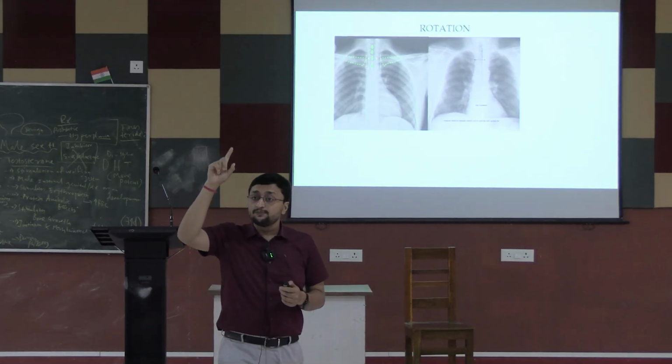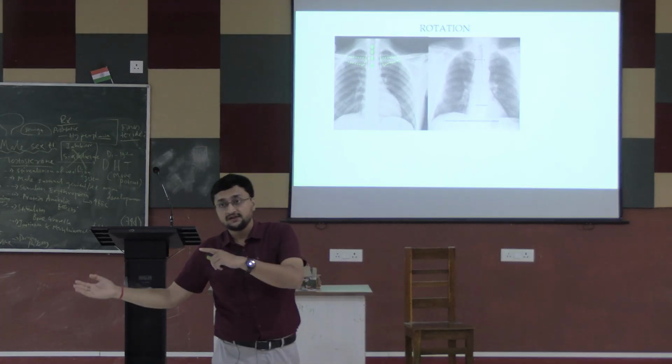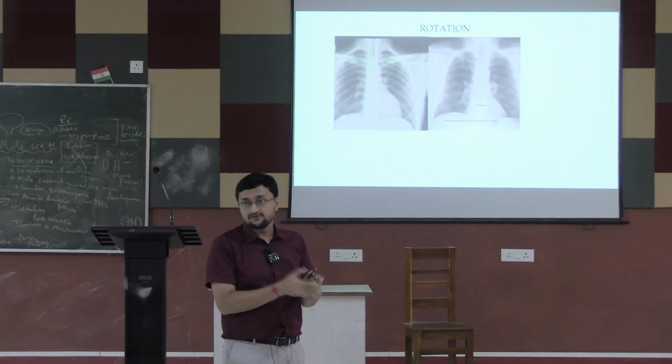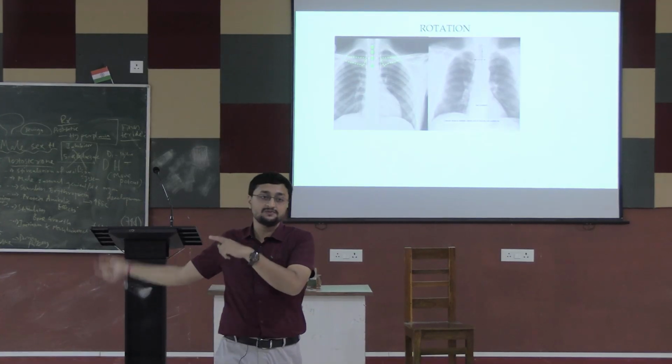You should assess the position of the trachea first. So if the patient is rotated, then the trachea will automatically be one-sided, right? So suppose the patient is rotated to the right side, the trachea will also be shifted.